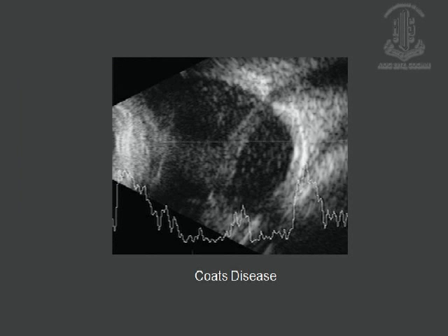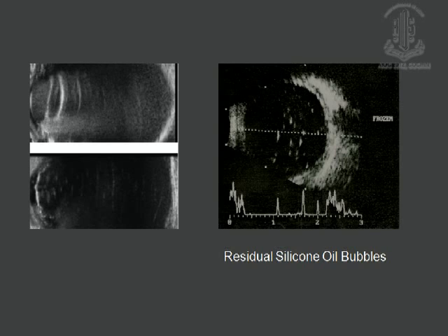Coats disease, skip. Silicone-filled eyes, you really can't do an ultrasound, you don't get much useful information in the silicone-filled eye. Post silicone removal, most of the patients will have some dot-like echoes. These are nothing but residual silicone oil bubbles, which usually don't interfere with vision.